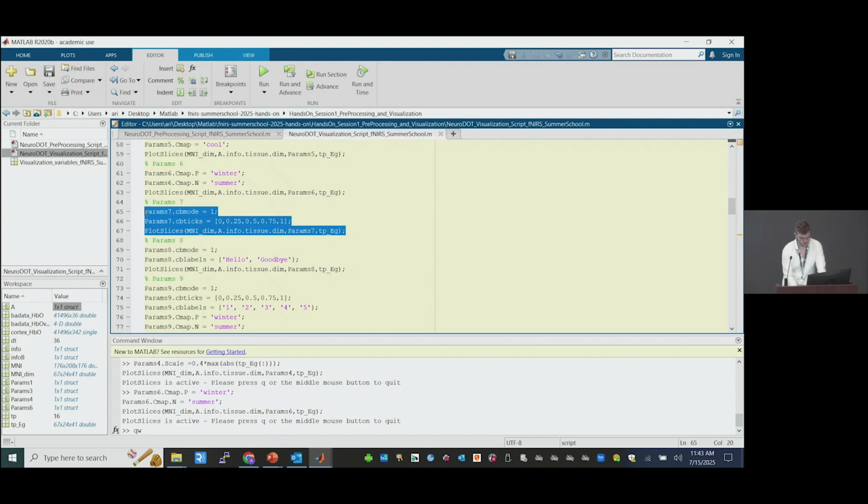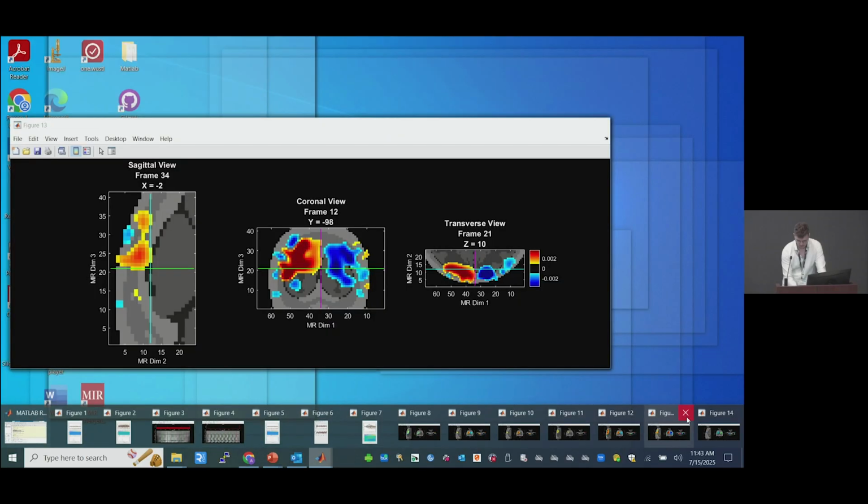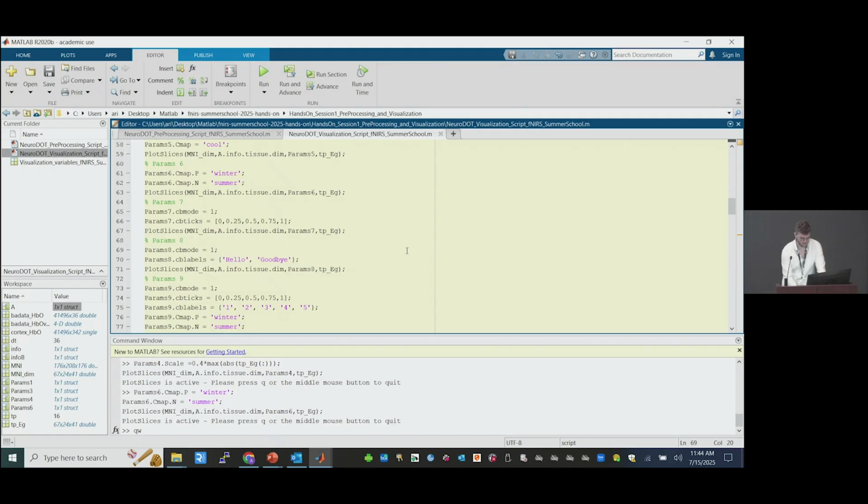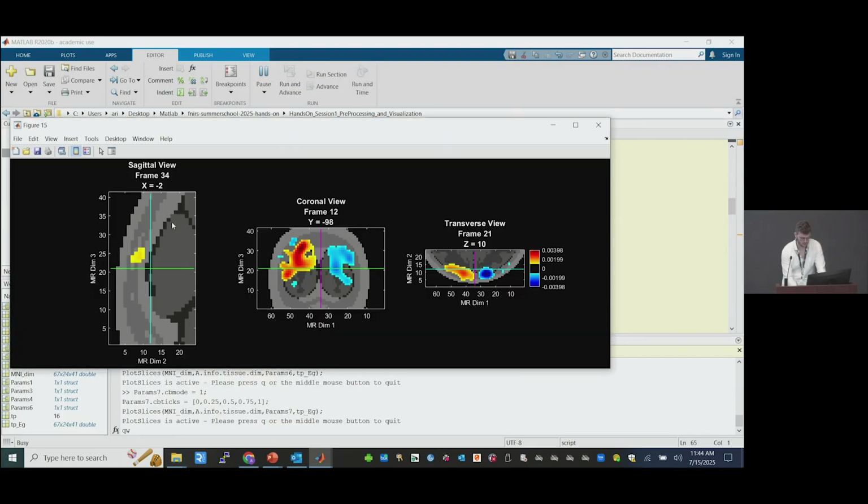So here, compared to our previous one, we see these are the default ticks corresponding to the data, but let's say I just wanted to set 5 ticks equidistantly spaced. I would set them between 0 and 1 like this, 0 being the bottom of the color bar, 1 being the top. And then now we have set, according to our data, 5 equidistantly spaced ticks.